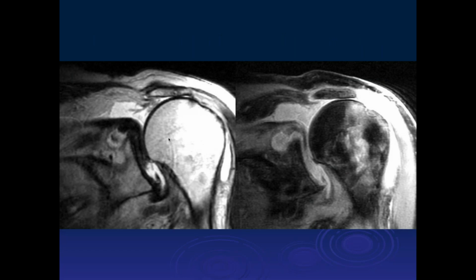Okay, Pablo? See, we have two coronal images. So the humeral head is elevated, the subacromial outlet is narrowed, so there's no supraspinatus tendon, or there's retraction of the musculotendinous junction consistent with the full thickness tear. There is also fluid, it looks like, in the subacromial subdeltoid bursa, a little bit in the joint space, and there's some remodeling, I think, of the acromion undersurface.